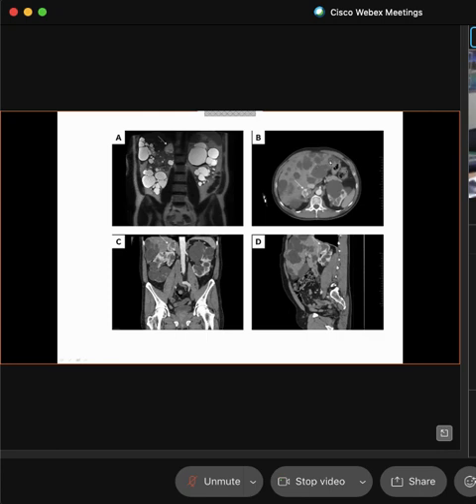Okay? So we have a huge organ on the right side that occupies a large amount of space, not only on the right side, but some of the left. What kind of organ would this be? What kind of organ mimics this type of shape as well that lies on the right side? I see it. Good job, guys.